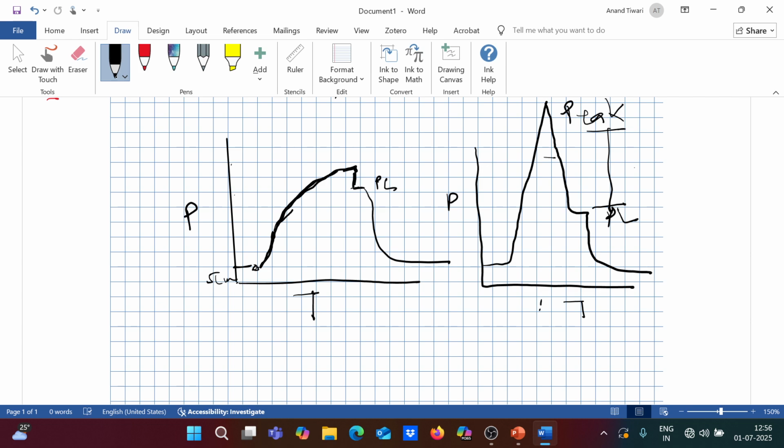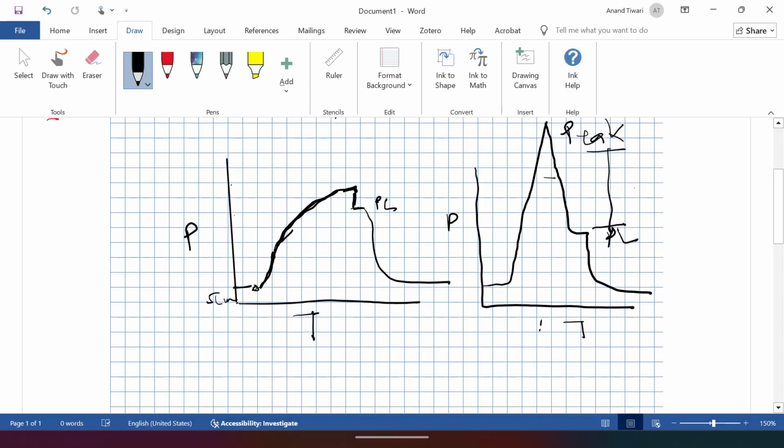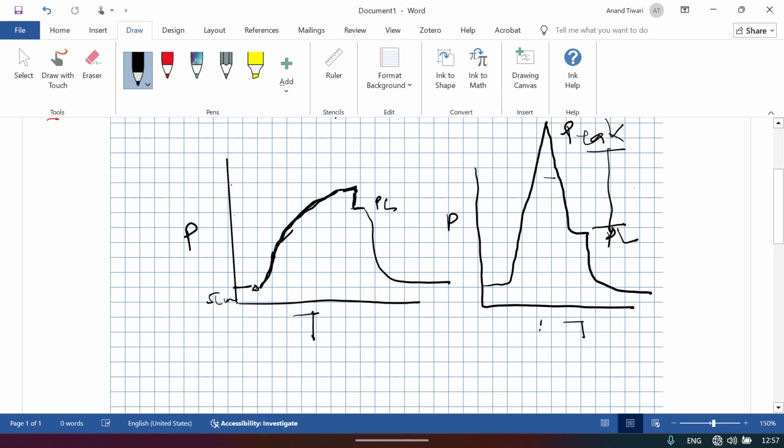So you can troubleshoot if there is a high pressure alarm and the peak pressure is high but the plateau is normal. Here what you are going to do is find out the cause. You start from your ventilator, you see from the ventilator and auscultate the patient. Try to see whether there is a bronchospasm, whether the tube is blocked, whether there are secretions in the tube, whether sometimes the filter is blocked. So you can troubleshoot the resistance problems looking at this graph.